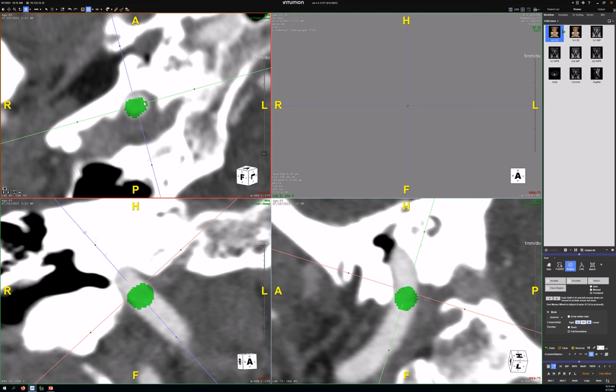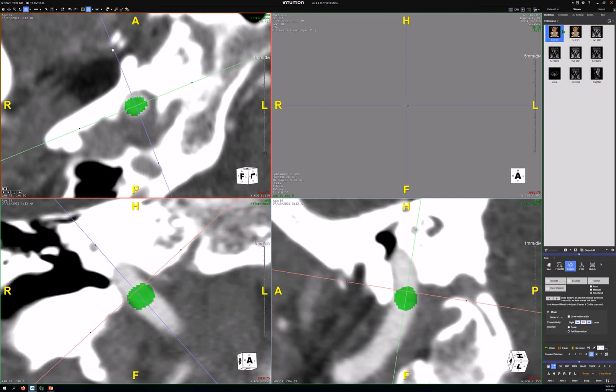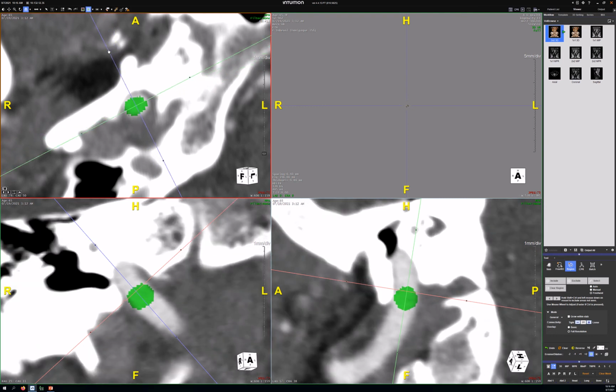So you see here, you're slightly different. Yes. Now, because the vessel's turning rapidly here, we're going to oblique it a little bit more. Oblique counterclockwise a few degrees, stop there. And here you're pretty much dead on. And here, we need to move a little. You can move a little and then adjust the long axes again. There we go. Okay, that's good right there. So now hold down Alt.